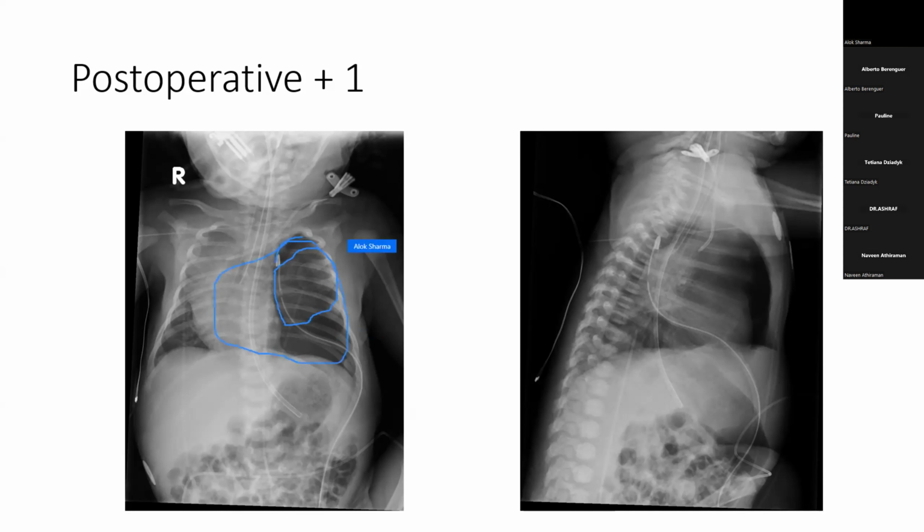A very sharp heart border. Once you've got a very sharp heart border, there's got to be an element of pneumomediastinum, in my experience. That heart border being that sharp with the lung, that's the medial border of the lung outlined with the border of the heart. So that's probably a pneumomediastinum with decent lung, I'd say, visible here, and anterior air.